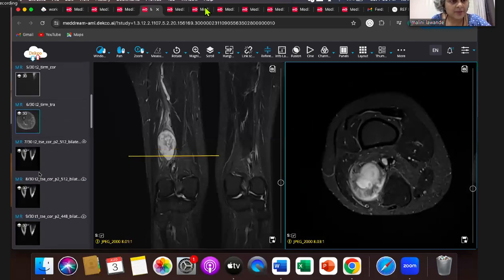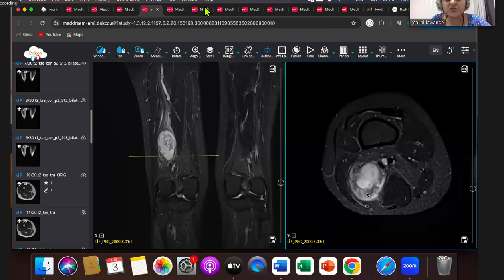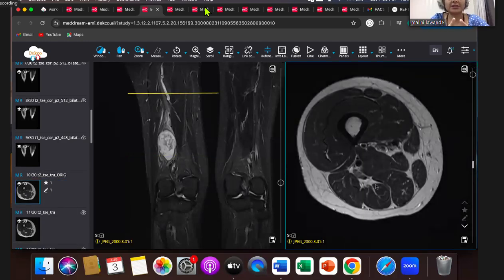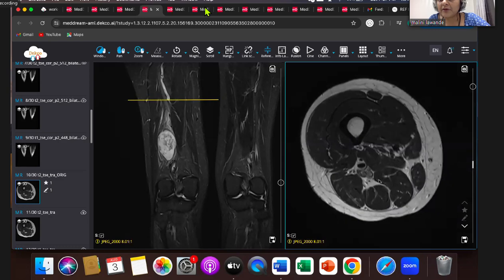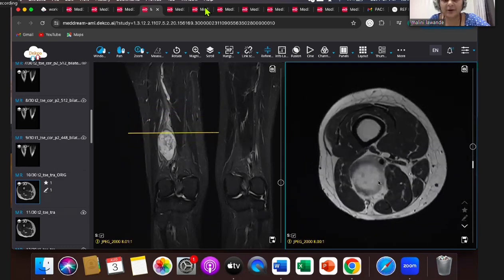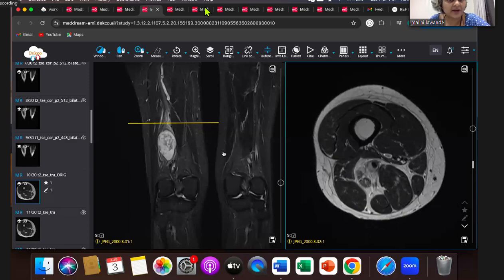Okay, let me show you the T2 weighted image. Remember, for any tumor imaging, bone tumor or soft tissue tumor: STIR and T1 weighted image in the longitudinal plane, axial T1, T2 and STIR, sagittal either T2 or STIR, any one of them is fine, and then diffusion and contrast. Okay, we are further seeing this, and I think all of you are getting the diagnosis right, which is good. Let's look at the T1 weighted image also.